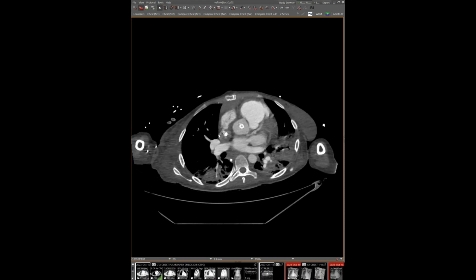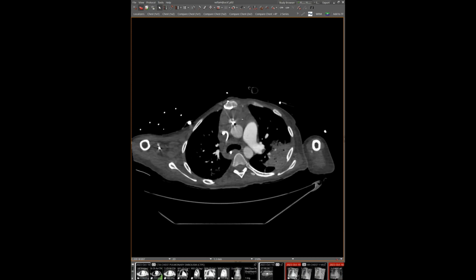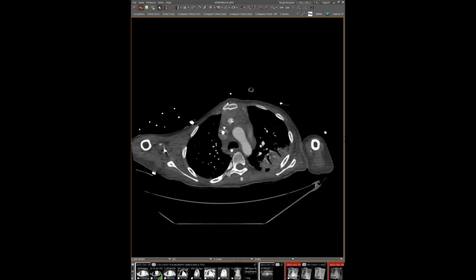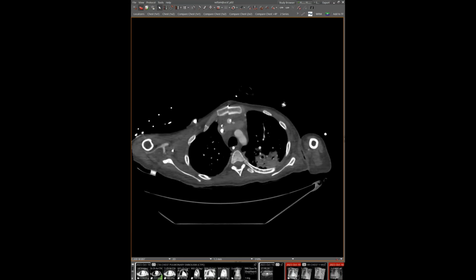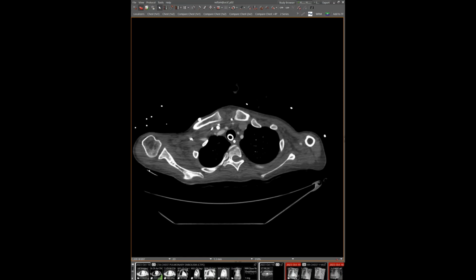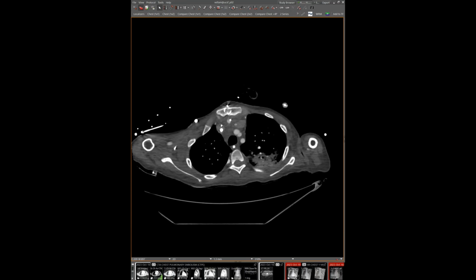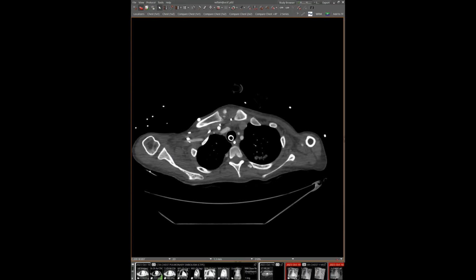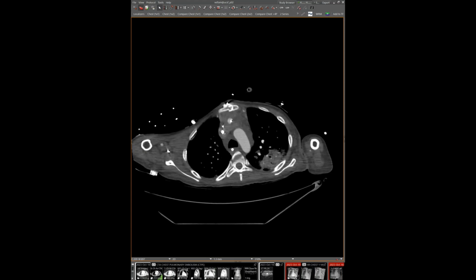So here's the Impella in the aorta, and if we continue upwards, we see that they actually put a graft onto the aorta specifically to place this Impella. And it sounds like from the op note, the reason they did that was the patient's axillary arteries were too small to accommodate the Impella, and they were going in to do a tracheostomy as well as, I think, in addition to removing that ECMO cannula.